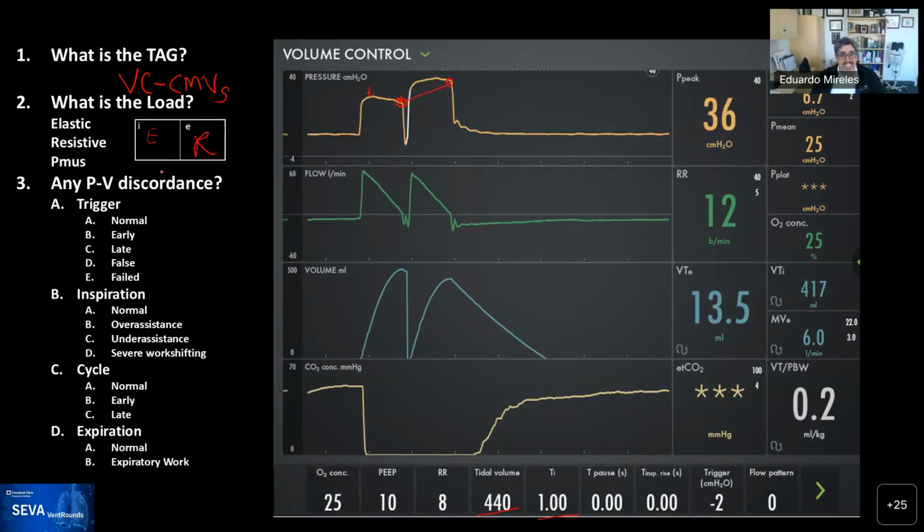And so this is a case of discordant resistance, in which you have normal inspiratory characteristics, so that it's only elastance, and then during the expiration, there's high resistance, and the ventilator is not causing this. You can see that it goes down essentially to baseline. So it's not the expiratory filter that is obstructed, because if the expiratory filter was obstructed, I would expect this to have a delay. So it's not the expiratory limb, because the same would happen over here with this.